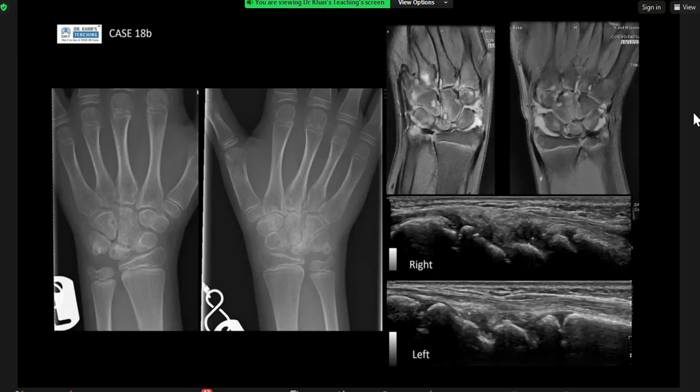There's a wrist X-ray for a skeletally immature patient, showing generalized osteopenia with multiple subchondral cysts. However, no definite fracture or bone lesion could be seen. There is some kind of ankylosis at the carpal bones, I'm not sure about it. On the MRI, there is a joint effusion with multiple areas of bone marrow edema at the carpal bones and at the styloid process of the ulna. There is also erosion and soft tissue change with multiple subchondral cysts.